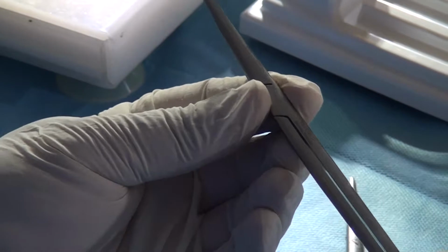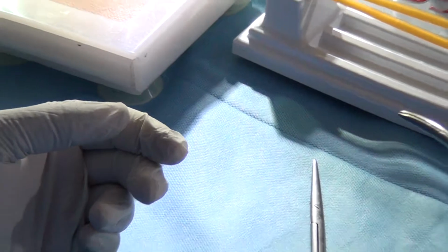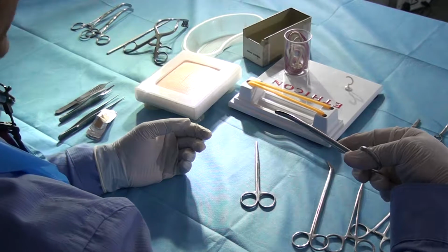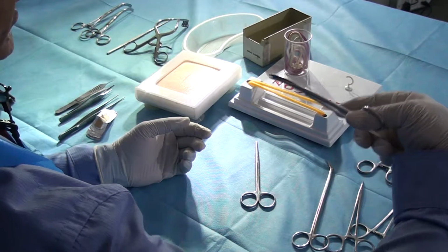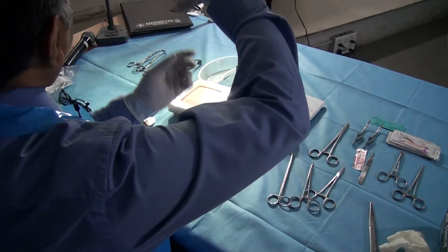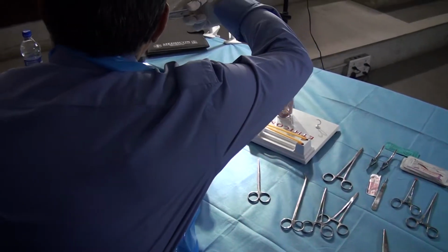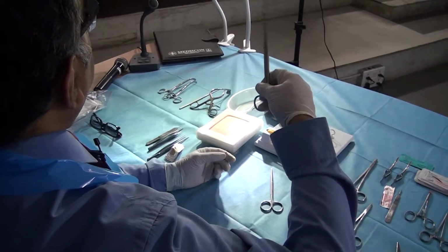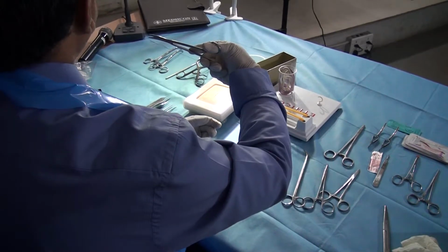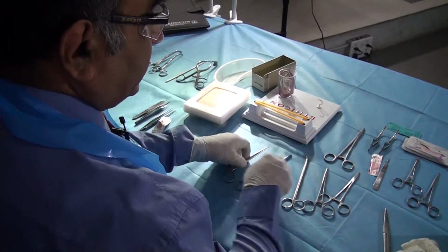Clear? Now, another reason why the tip should be towards you is, can you zoom out please? If I'm making a shadow cut from right to left, you can watch me as I'm cutting, rather than looking at the screen. You can watch me directly. I can go straight on looking at the tip. If the tip is away from me, I'll have to adjust my arm all the time, so I'll be all over the place. So it's convenient to have the tip looking at me, and we can simply take it straight. Clear? Yes, sir. So that's about the scissors.